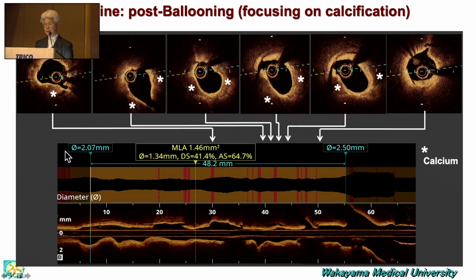And in the distal portion, the diameter is around 2, and proximal 2.5. This is an LAD, so we need much bigger in the proximal side, and a little bit bigger, because this is around 48. So how to decide? Based on the lumen, we cannot see the EEL to EEL, so we cannot identify the distal vessel area.